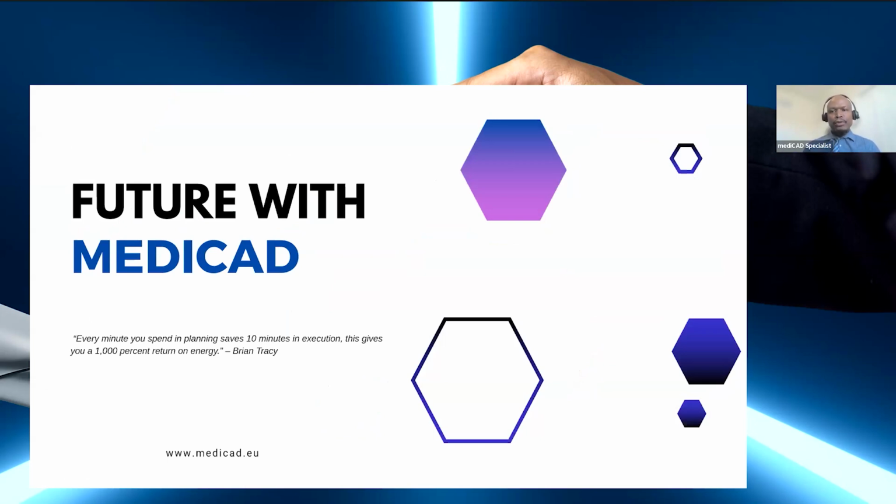This demonstration will be basically about 3D hip. It is a cutting-edge digital solution designed for preoperative planning in hospitals and clinics. Today, I will walk you through the key features of the platform and show you how it simplifies and optimizes preoperative planning for hip total arthroplasty surgery.